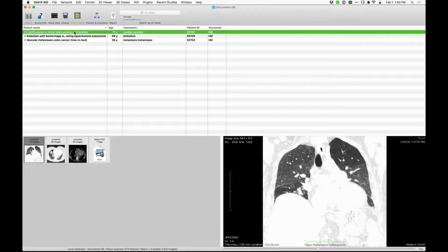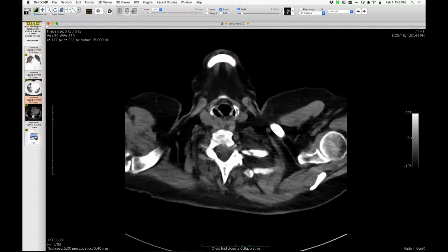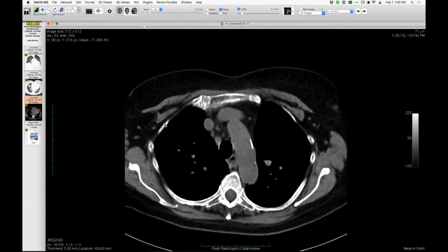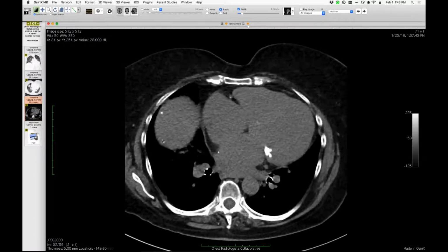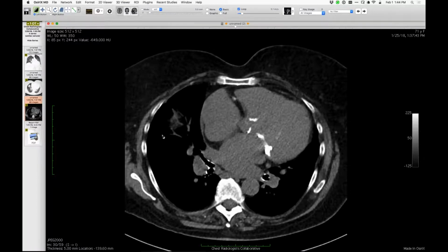All right, let me show you these. These are relatively mundane compared to what you've shown, but maybe I haven't noticed this before. Let me show you this case of very florid mitral annulus calcifications in an older person. Some calcifications, of course, within aortic valve leaflets.